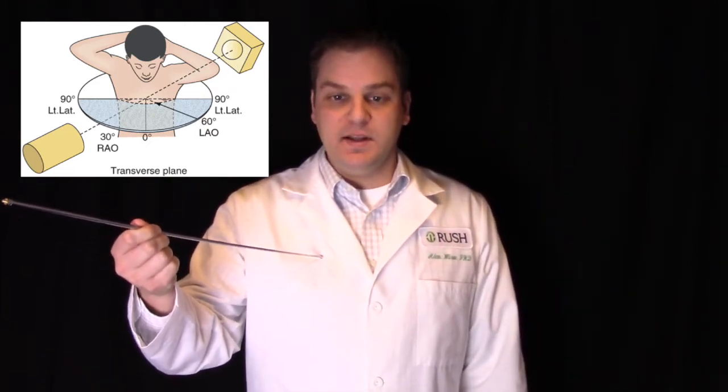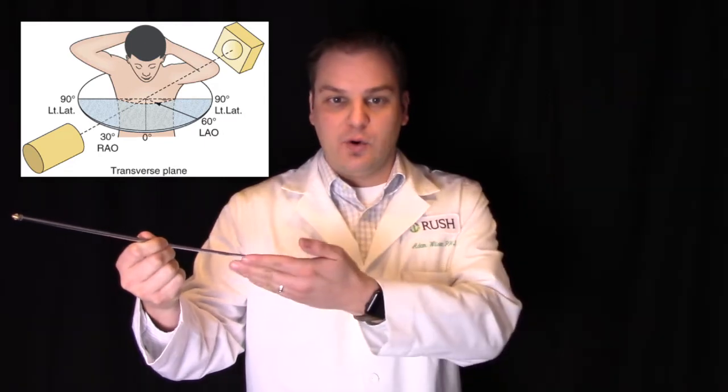To interpret coronary angiograms, one must understand the angiographer's perspective. Coronary arteries are best visualized from either the left or right oblique angle. This angle refers to the directionality of the X-ray beam as it enters the body. For example, a right anterior oblique view is best for visualizing the left coronary artery. This means the X-ray beam enters through the right thorax at about a 30-degree angle to detect contrast in the left coronary artery. A left anterior oblique view is best for visualizing the right coronary artery.